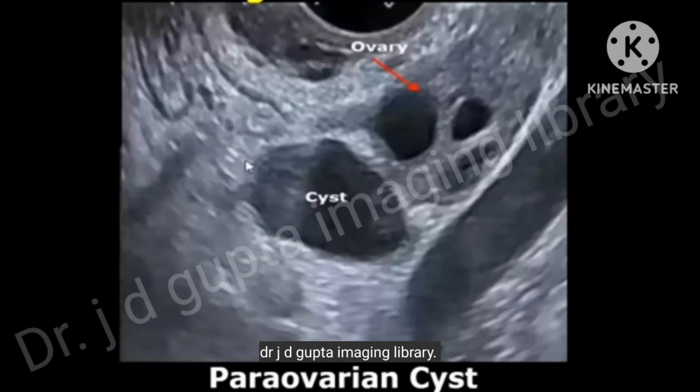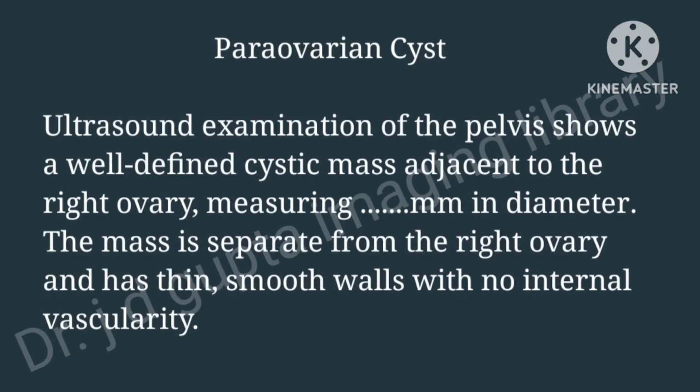Next one talks about parovarian cyst. Ultrasound examination of the pelvis shows a well-defined cystic mass adjacent to the right ovary, measuring in diameter. The mass is separate from the right ovary and has thin, smooth walls with no internal vascularity.